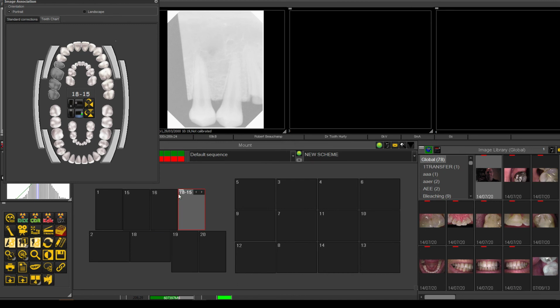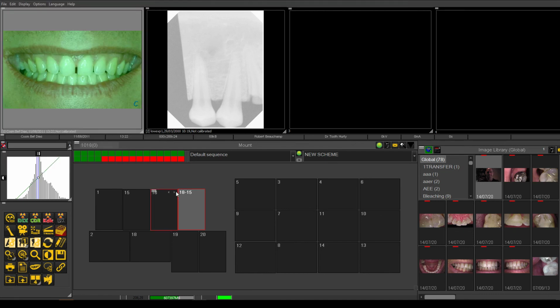Here I've chosen the international/Canadian tooth numbering system, but again, in the setup, you can have it set up to the US numbering system, the Canadian numbering system, or the international numbering system. And it will classify the teeth based on what you have chosen. So this is where now you can orient it by tooth number. And again, you have to exit on this chart to make sure that it remains with the tooth number. Okay, so now I've done that.